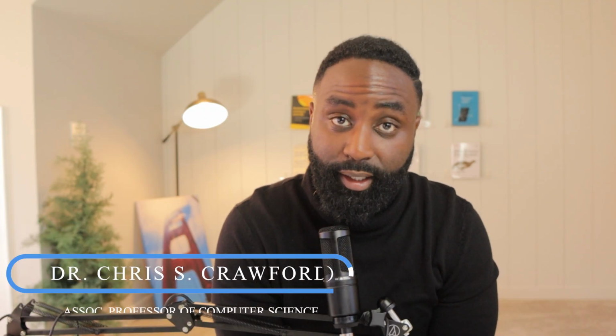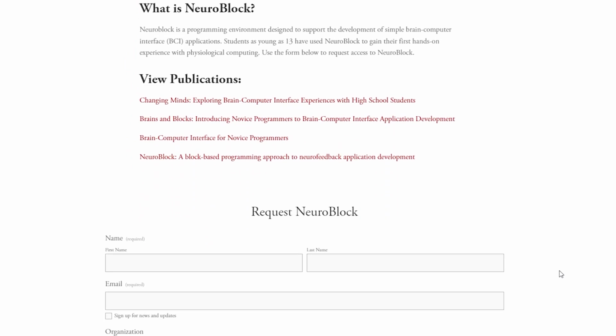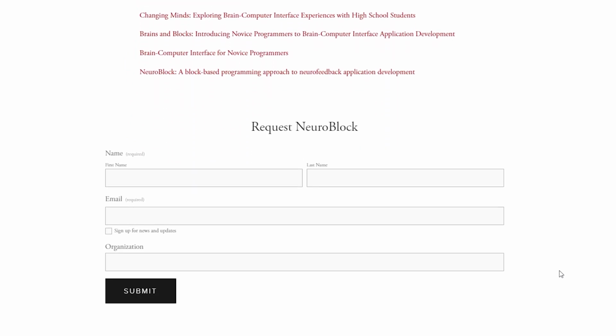To download Neuroblock, visit the link in the video description. Once you get there, you should either see a request form or a download button. If the request form is up, please enter your information and the download link will be sent to you shortly. Once the file is downloaded, open the file and follow the installation instructions. Once you have everything installed, you should see this interface.